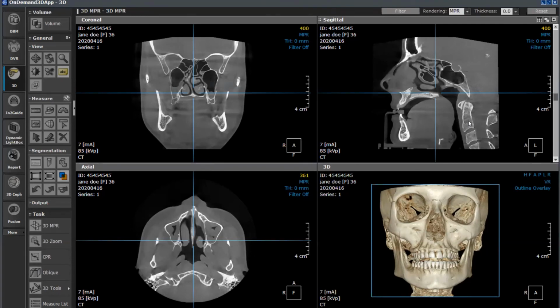But if you don't want to have that, if you're just looking for something like an endodontic evaluation, you can also do the free field of view mode. The free field of view mode allows you to essentially mark off a space on the dentition that allows you to just choose that space alone to view it and take just an image of it.